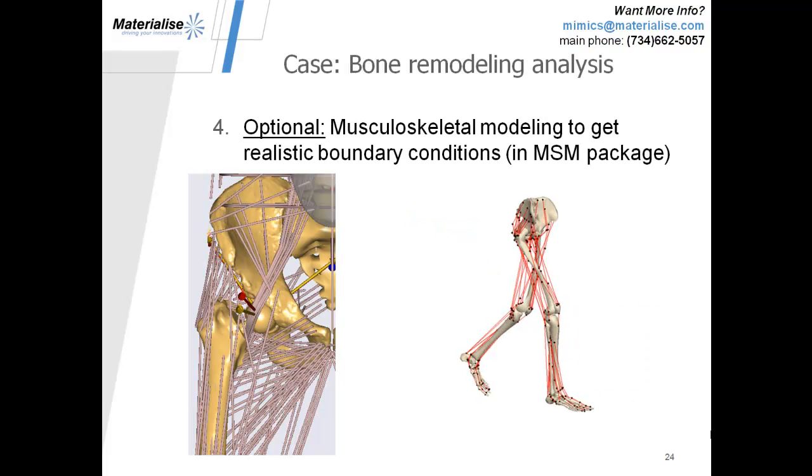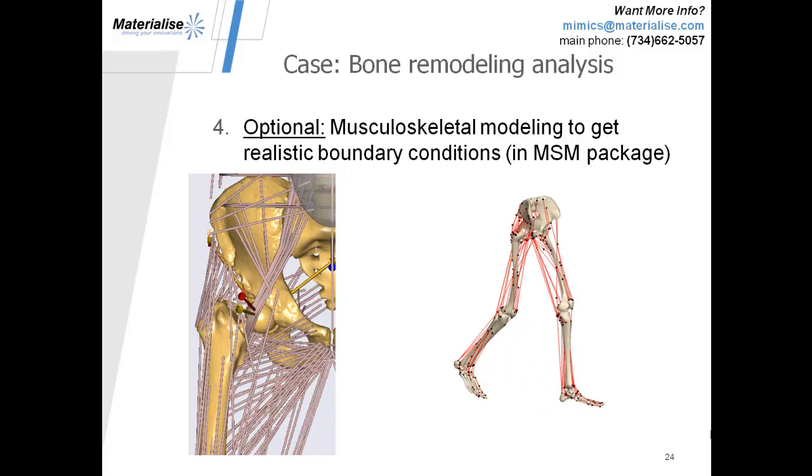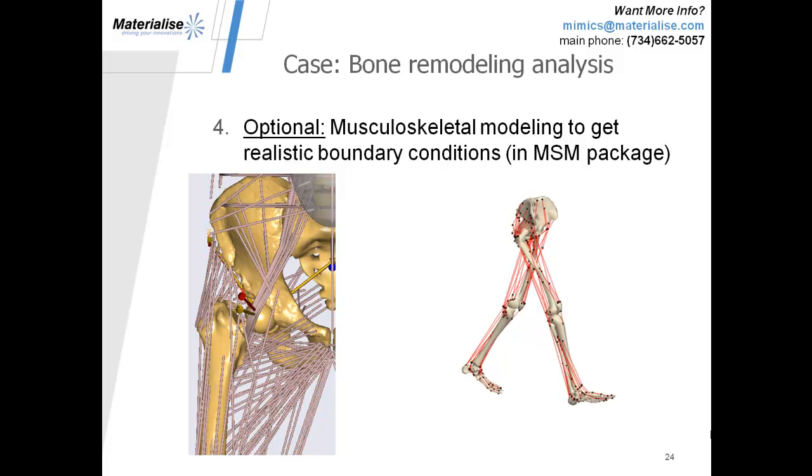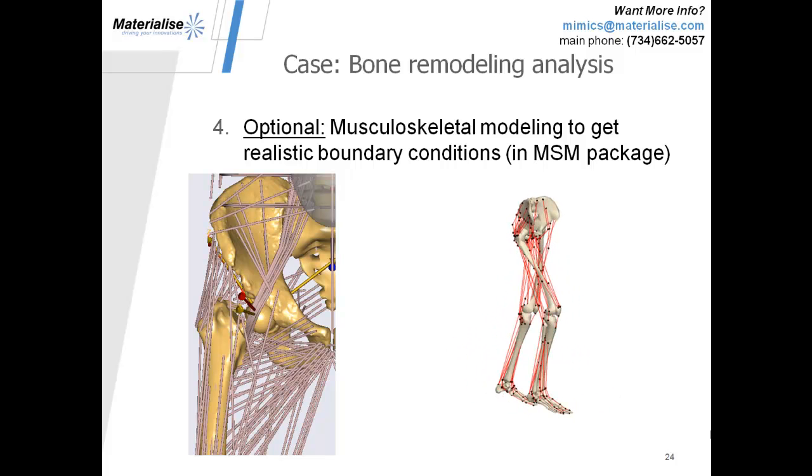Patient-specific data can go as far as linking to musculoskeletal modeling packages. And what you can do now is not only look at how the bones are interacting, but really apply that musculoskeletal modeling and look from a patient-specific level at how those bones are moving together and interacting.